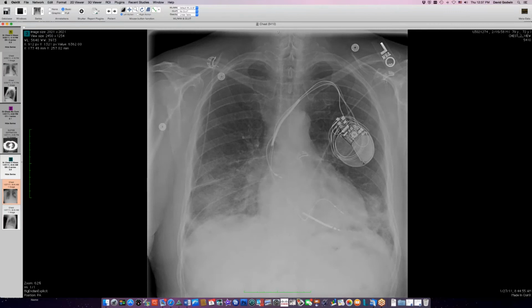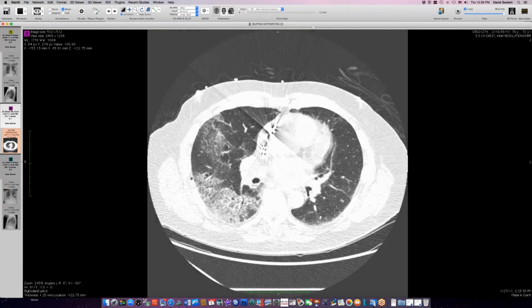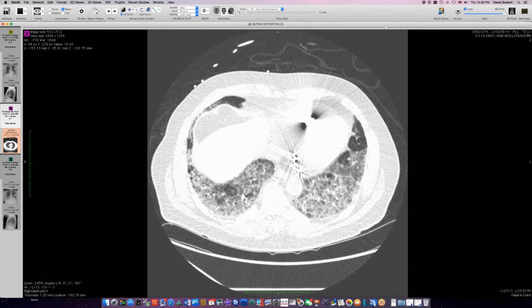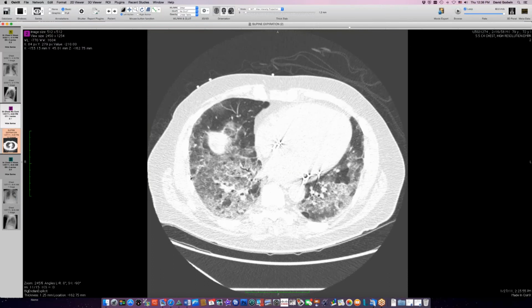Okay, so here's another person who has heart disease, atrial fibrillation, and was put on amiodarone. His radiograph was somewhat worse now with this basal stuff than the earliest radiograph we had, which was already not clear in the lung bases. So he has this low-grade lung consolidation on both sides, basal predominant, and here it is on CT. So it looks ground glassy with some spared lobules within it.